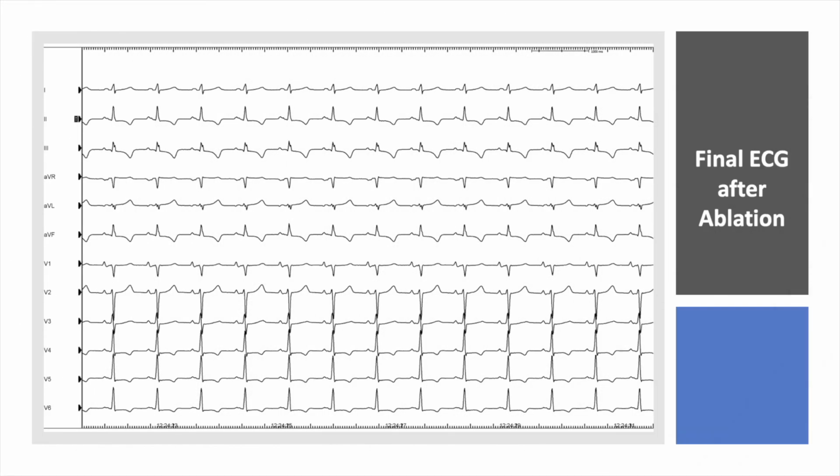So in conclusion, the first ECG actually showed a sustained ventricular tachycardia with oscillating exits. The subsequent ECGs showed an interesting phenomenon of exit block at the level of the VT circuit. The patient underwent catheter ablation, and here we see the ECG in sinus rhythm after successful ablation.